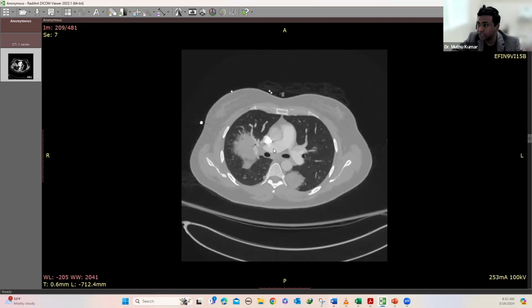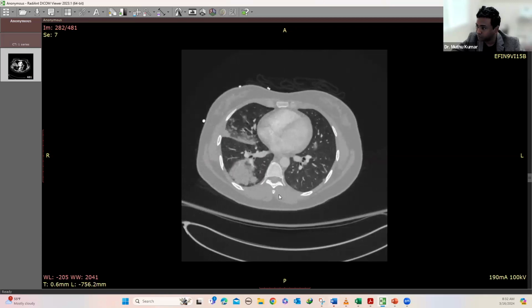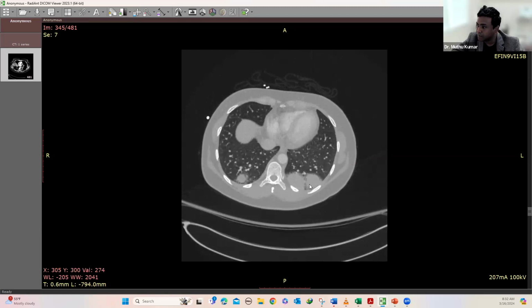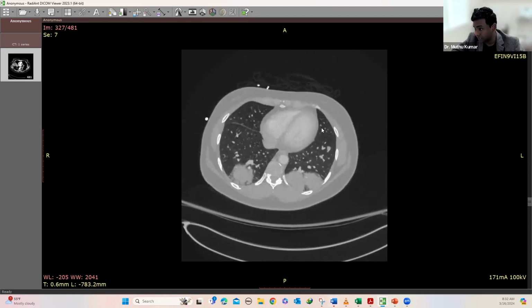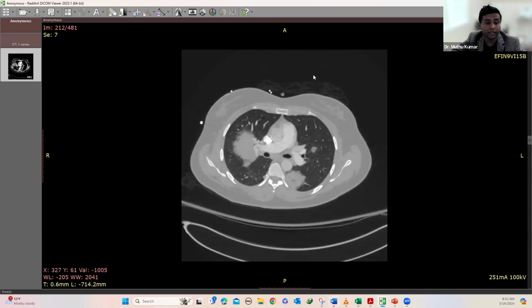In this patient, there is incomplete filling of alveolar spaces by the hemorrhage, and that is the reason the periphery of the opacities have ground glass and the center is consolidated. And then as we go down further, you can see peripherally placed mass-like consolidation with surrounding ground glass halo. You can call this a halo sign, but we cannot call it fungal pneumonia because it is not in the appropriate setting. And you can see there is a cavitation.